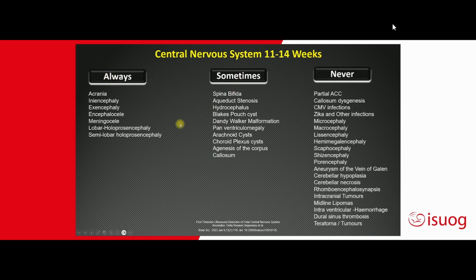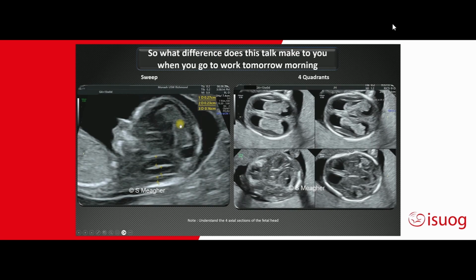It's important then going forward tomorrow morning as to how you approach screening and diagnosing the first trimester, looking at sagittal and axial imaging. Look at the brainstem, look at the intracranial translucency, look at the cisterna magna. And if you're going to take one measurement, I would suggest you take the intracranial translucency, not so much as a marker only of spina bifida, but as a marker of it being dilated, of aneuploidy, posterior fossa anomalies, microdeletions, and so on. It's a very powerful marker, and it's a very powerful marker for digynic triploidy, where it's dilated in over 2/3 of cases.